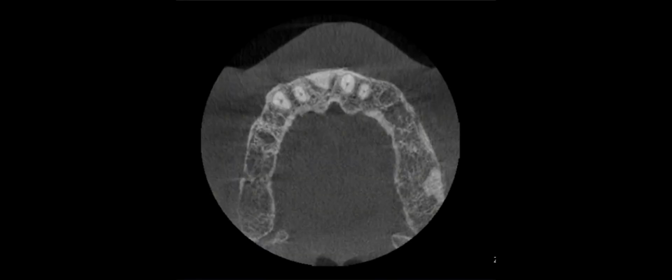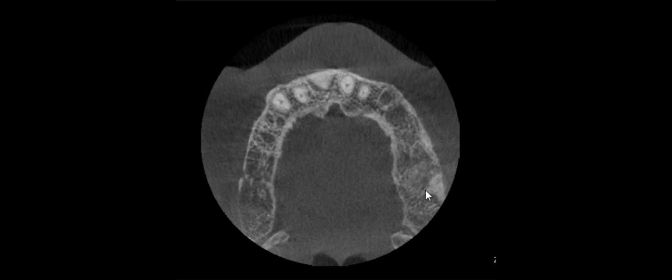Okay, so if you look at now this screen here of the 3D X-ray cross-section, you can see where we've grafted the bone. The bone at the front tooth here normally would have been significantly lost there, but this really dense white area indicates the grafting to maintain the bone ridge in a reasonable contour. Much the same over here where the upper molar was lost. We've grafted that area there, and we've grafted a little bit along the edge here.